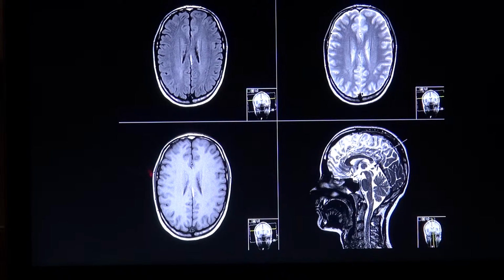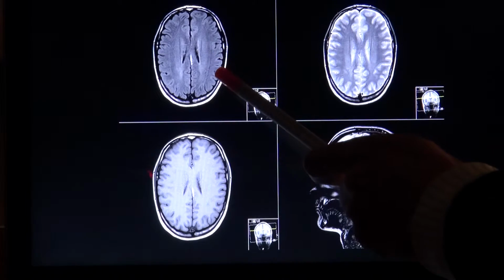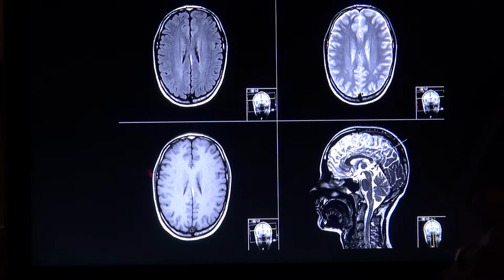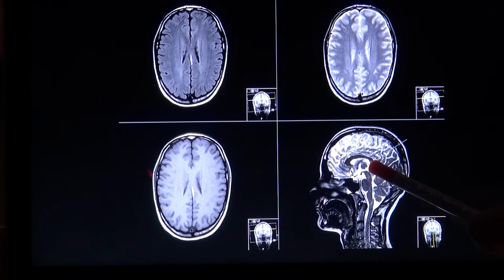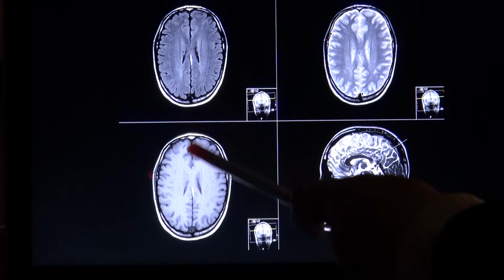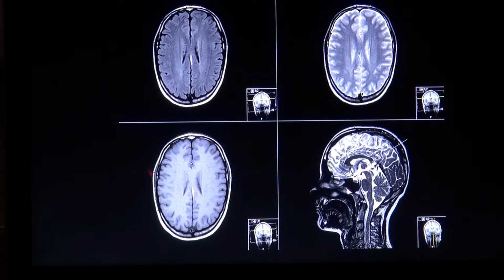When imaged with MRI, you will find a bright lesion on T1, T2, and FLAIR. After fat suppression, the lesion becomes dark. Here you see the bright lesion above the corpus callosum. The straight, bright lesion is seen on the other corresponding sequences.